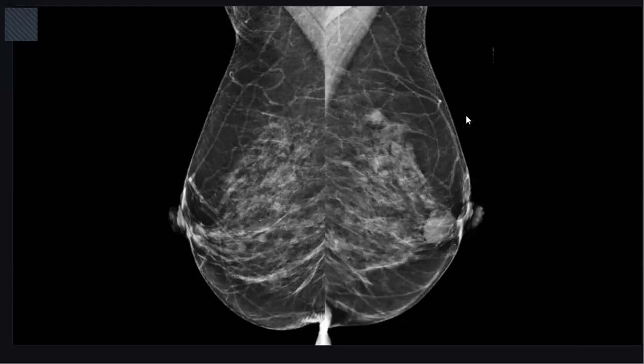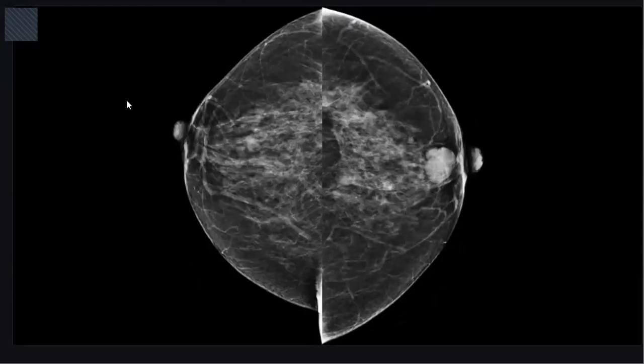Also, I'd like to assess the ACR of the breast density. It is likely ACR2. And this two opacities are seen in the mediolateral oblique views. I'd like to compare in the craniocaudal views of the left breast. Here, the pertinent negatives: no evidence of nipple retraction, no evidence of skin thickening, no evidence of axillary enlarged lymph nodes.